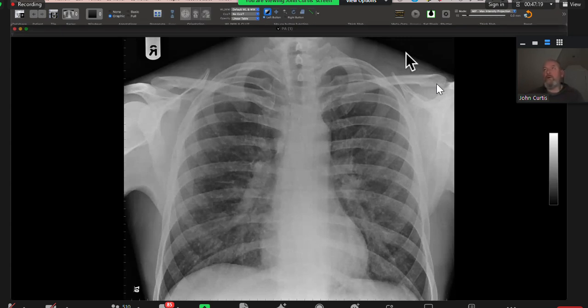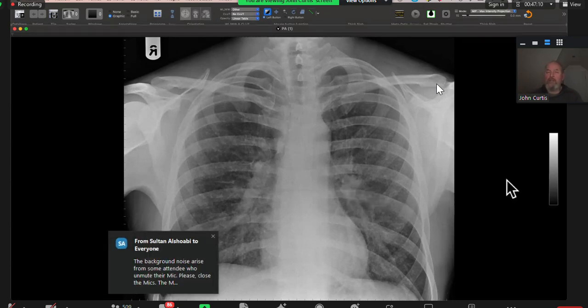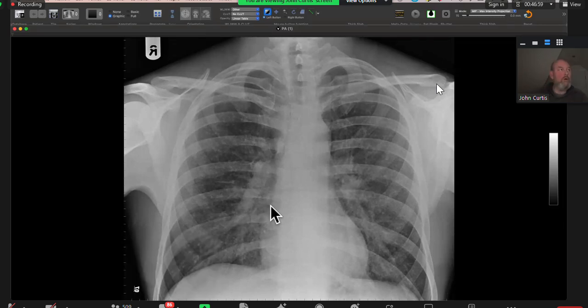Just point that out using your mouse. This one. Yeah, okay. Don't worry about that. The hilar regions are normal. Just tell me about the nodules. Yeah, I can see that the nodules look small in size. They are scattered. What's the diagnosis? They are small in size.